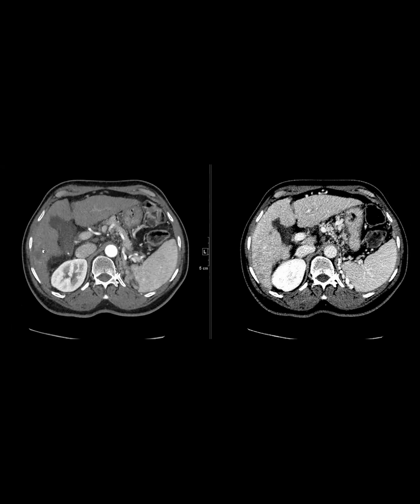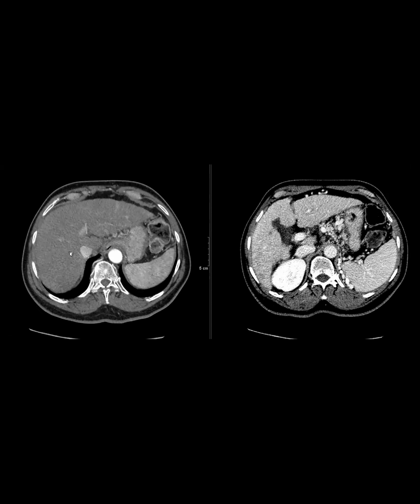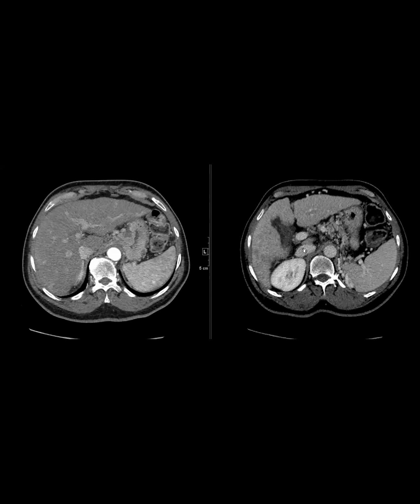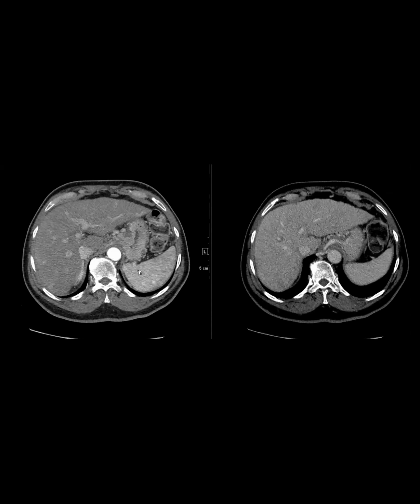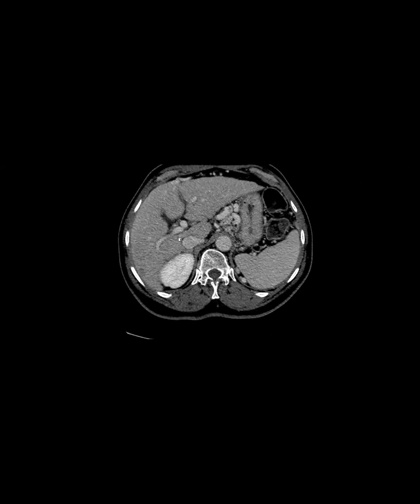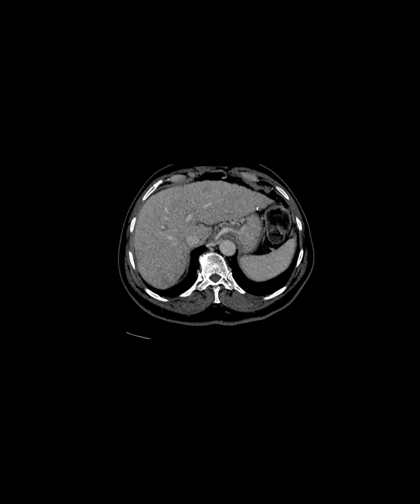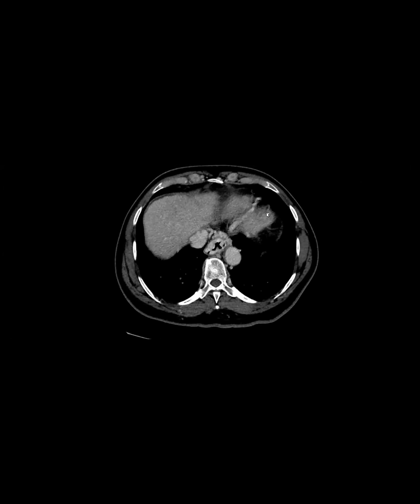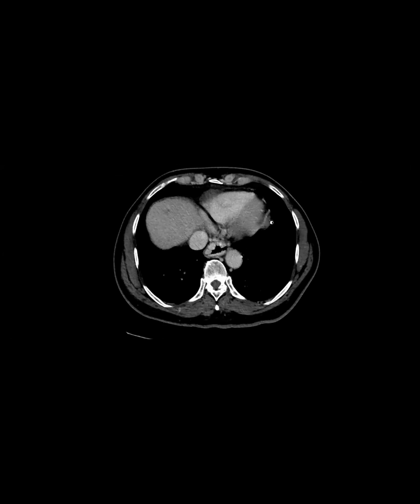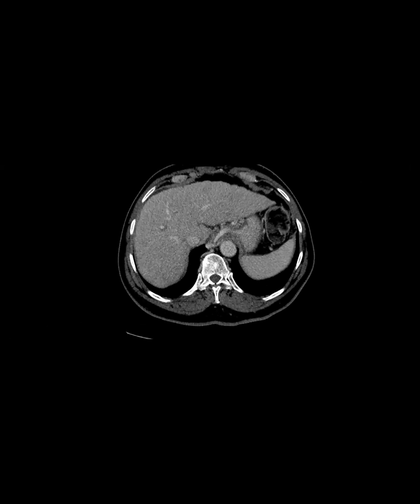Patient had prior treatment, and many of these lesions have arterial phase hyperenhancement and washout appearance, as you can see here, this one. And none of them have a capsule. In the portal venous phase, you can see none of them have a capsule, and all of them are under 2 centimeters, right there. So according to OPTN, these are not HCCs.